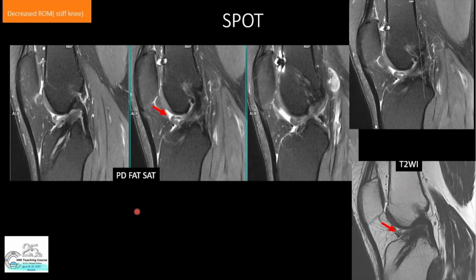Once again, the patient has presented with stiff knee, and I pointed towards the abnormality. There is a pointer towards the abnormality. So what's that? Localized arthrofibrosis. That is also called a cyclops lesion, and it is called a cyclops lesion because it is supposed to resemble the one-eyed monster which has been described in either Greek or Latin literature. So when the surgeon goes inside through the anterior portal, this is something which is staring at him in the midline of the joint space. So that is the reason why it has been called cyclops.